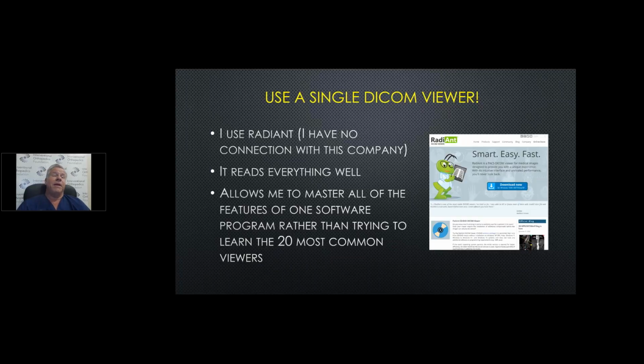As you know, you get an MRI CD from a patient, and it could be one of 20 or 30 different programs, and there's no reason for you to do that. That's not the way the radiologists do it. They'll use a single DICOM viewer that they get comfortable with. So this one is really a nice one. There may be others on the market, but we found this a couple years ago, and we've never looked back. It's awesome.